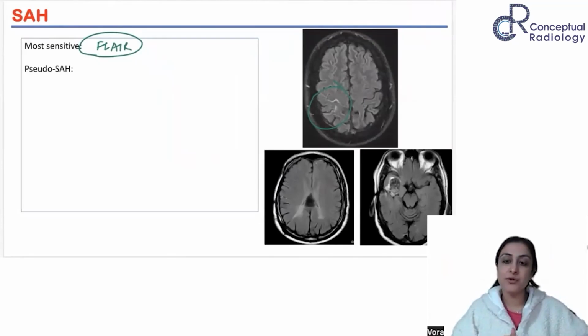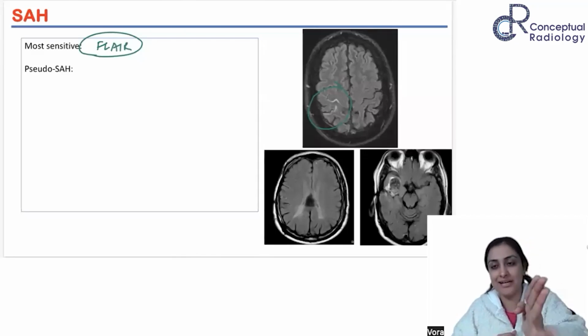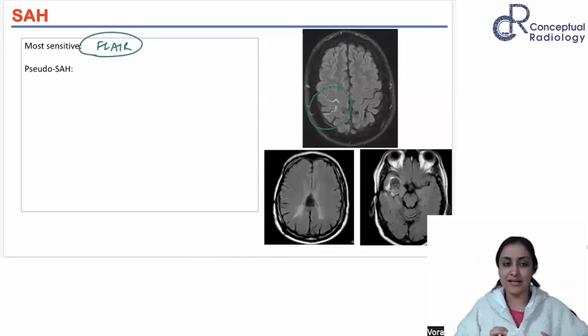SDH versus subdural hygroma on CT, can't distinguish there. If SDH becomes isodense, we can't distinguish. So prior imaging will help, if you see the evolution, that's the only way you can distinguish. But if you see just one time point, isodense, we can't distinguish. Lamina terminalis की भी बात करेंगे. All cisterns and all anatomy I'll teach you. Don't worry. Next week I'll teach you, okay?